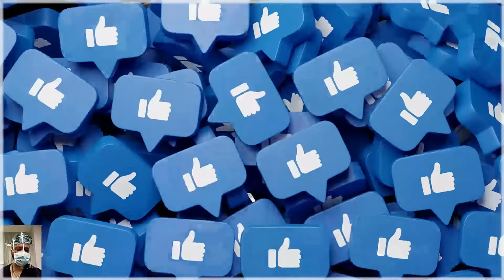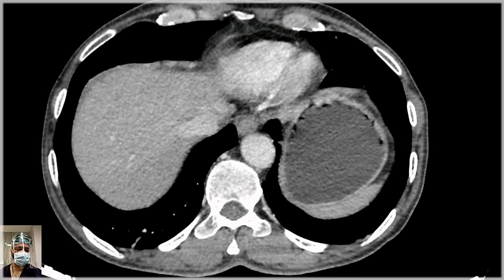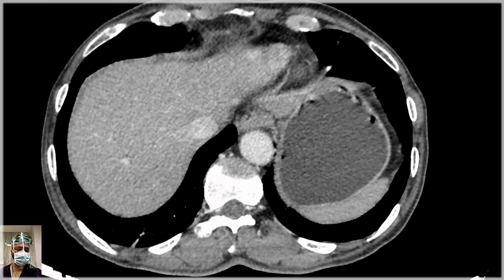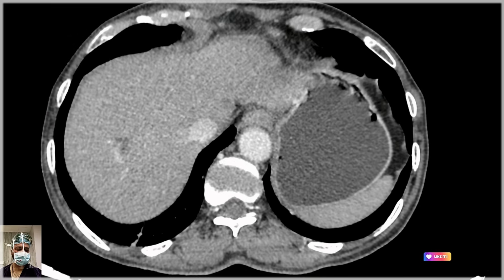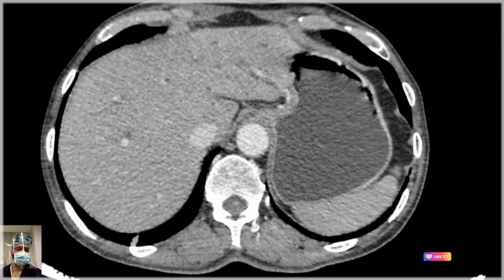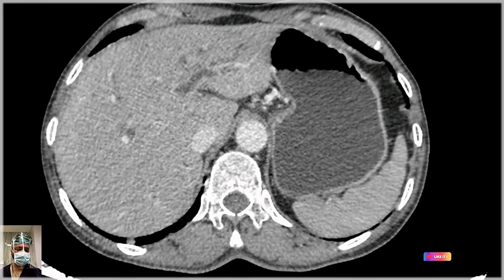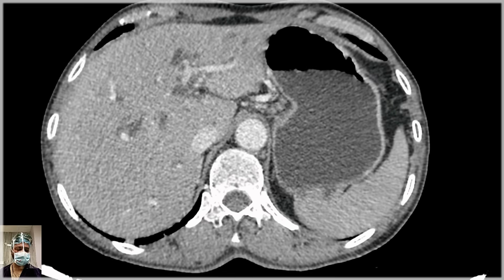So this is the video of triphasic CT scan abdomen. His liver was looking normal except for the bilobar IHBRD, which were dilated till the peripheral radicals, that is second order, third order radicals were dilated, and the portal vein was normal.